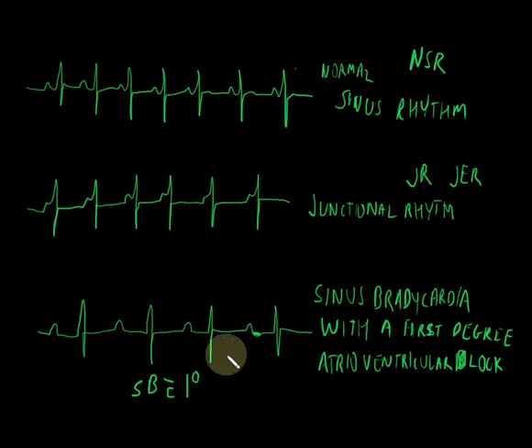Now, if my heart rate were 70, for example, even with that long interval, it's very possible to have a rate of like 70 or 80, then it would be sinus rhythm, or SR, with first degree. If the rate actually got up as far as 110 or 120, that's also possible as long as the PR interval is consistently over the 5 blocks. So it's like a 6-7 block PR interval. You'd have sinus tachycardia, or ST, with a first degree AV block. And it's going to be fairly rare, if ever, that you will see an SVT level. You can't have this big long gap in the PR interval and actually have a rate over 150. There's just not really enough room for that to happen. So you're not going to see sinus SVT with first degree block virtually ever. So sinus brady, sinus rhythm, sinus tach with a first degree block.